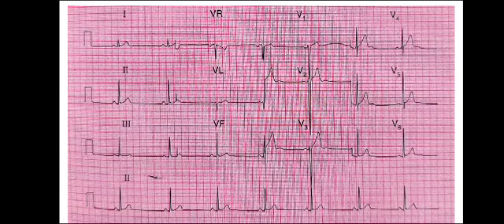And also, you should know that the gold standard to confirm the left ventricular hypertrophy is echocardiography. So we can suspect on an ECG, but we can confirm this on echocardiography, which is a gold standard to know the left ventricular hypertrophy. And also remember, what is 1 millivolt in an ECG? The 1 millivolt is the 10 millimeter in an ECG. So this is basically the 2 large boxes or 10 small boxes.